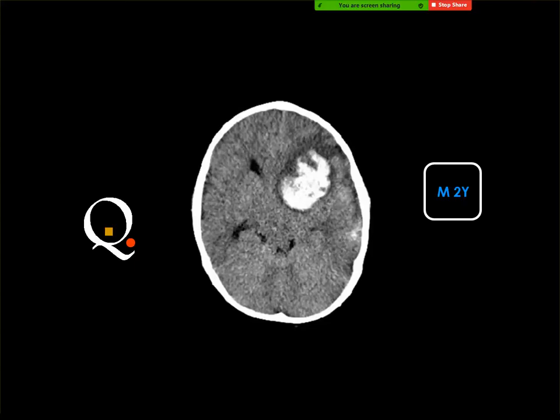Either this is an arteriovenous malformation or cavernoma. This can be solved by MRI. And also the issue of a brain tumor can also be assessed by MRI. But in the presence of history of trauma, you consider it post-traumatic hemorrhage.